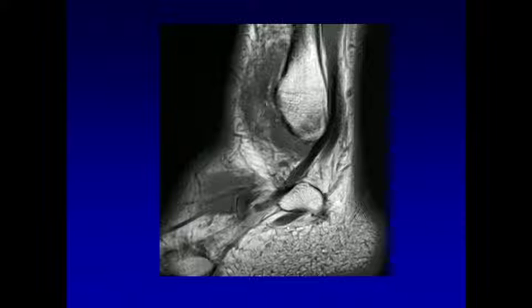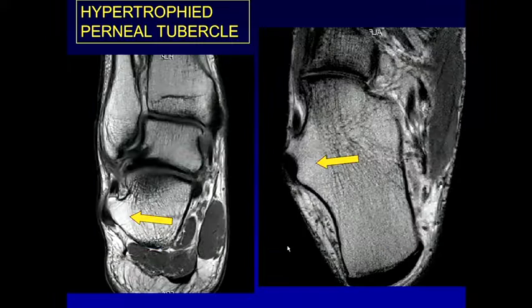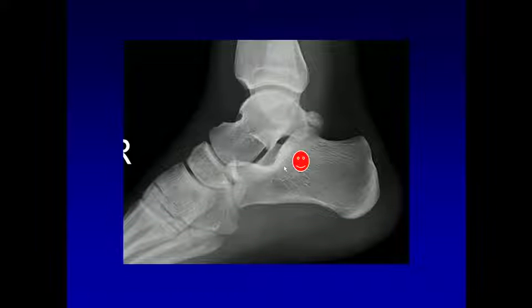Keep in mind that when you see peroneus longus pathology, you may have an enlarged peroneal tubercle. And this is a coronal image, big peroneal tubercle. You could see it displacing the longus in particular. And this is another patient with a very big peroneal tubercle, which is actually confluent with the retrotrochlear eminence, and we could see that the peroneus longus is markedly enlarged.